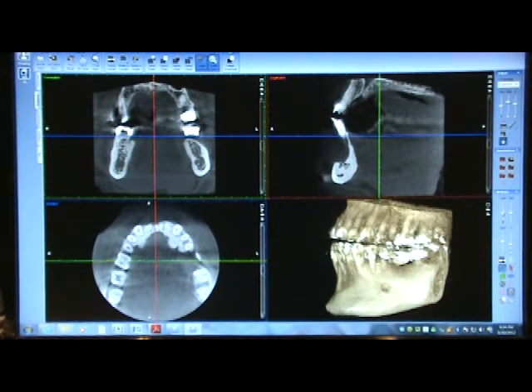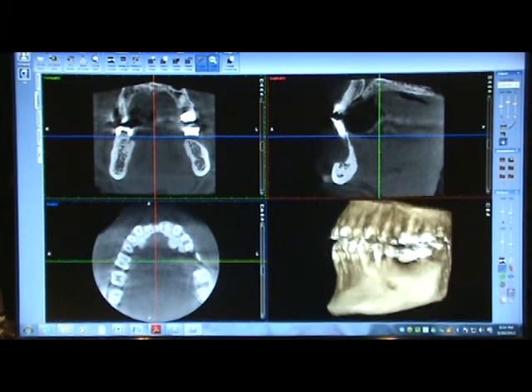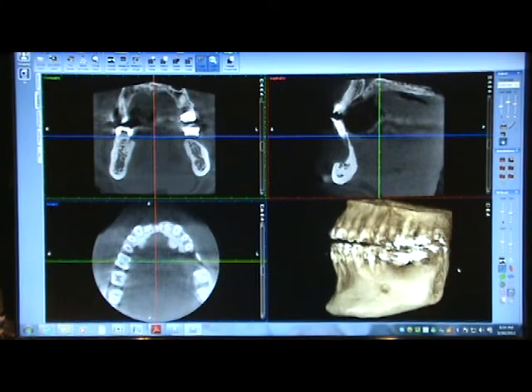Here we go. Now, left click allows you to rotate the model for viewing purposes. There's a little light bulb here, and then you'll left click, and as you can see, you can manipulate the shadowing. So we'll go back to our light bulb and left click that again.